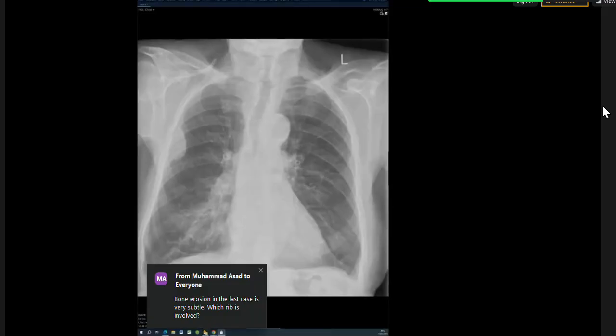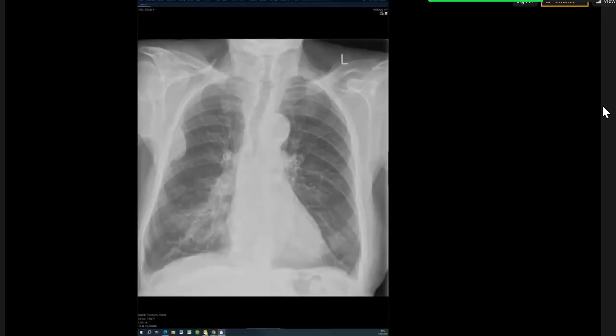When somebody is immunocompromised, they have a bit of everything going on, and this patient was actually reacting to a drug as well. So this was a mixed diagnosis of hypersensitivity with superadded atypical infection. But in miliary TB, you should not have tree and bud. In endobronchial spread of TB, you have tree and bud and all these nodules. When you have centrilobular nodules, that implies that there's something inside the airways. So if that was TB, it wasn't miliary. It was endobronchial spread of TB.